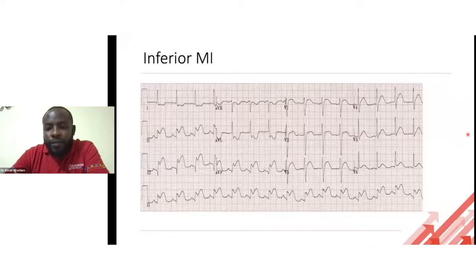If there are any types of blocks, first degree or second degree blocks, usually the most common one, depending on how unwell the patient is, on how the hemodynamics are, you might require at some point to pace the patients if they are type 2 second degree blocks. So if the patient has received fluids which are refractory, the bradycardia, the hypotension is refractory.